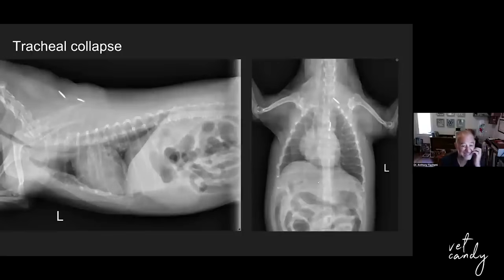Dogs, we see a lot of this: a small breed dog with a trachea that just looks so homogeneously soft tissue opaque. This is a small breed dog with a honking characteristic to his cough. This dog has chondromalacia causing tracheal collapse. Super, super common in our small breed dogs in New York City. It's not uncommon to see a concurrent bronchointerstitial lung pattern in these guys because chronic bronchitis is very common, occurring concurrently with chondromalacia causing airway collapse.